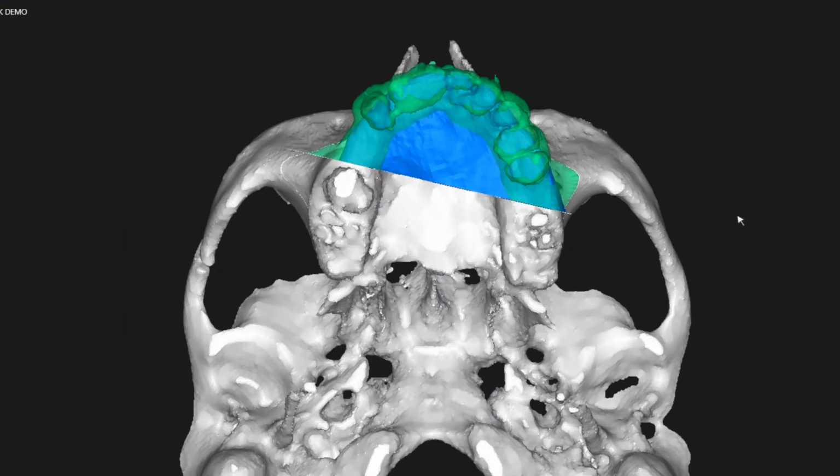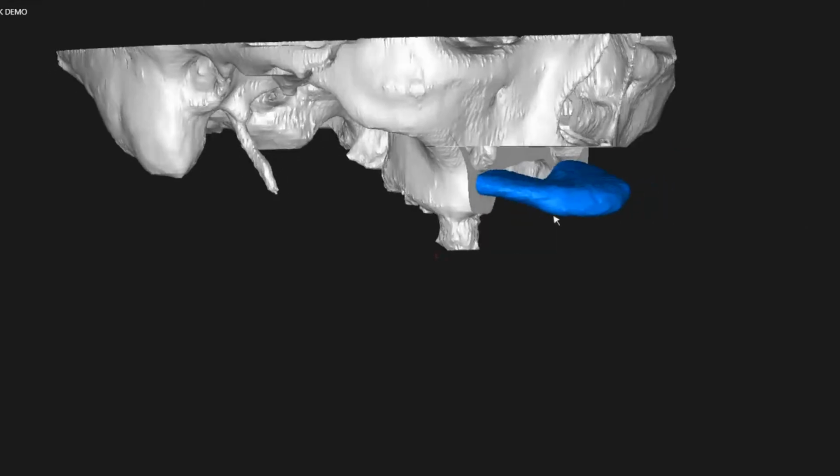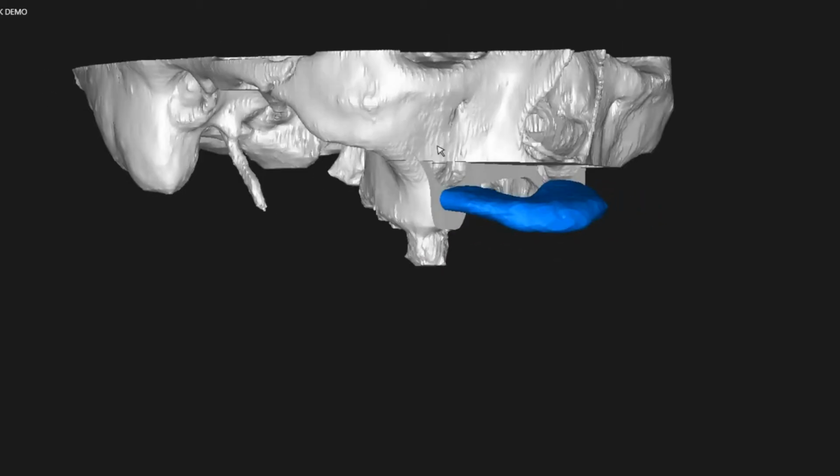While you've got the horizontal views, your lateral views, we might as well sort out the plates. Does that work for you if we do it that way? It'll just take me some time to load it into the plating software for this one as well. If you want to talk through what you're looking for, I can start getting that set up.